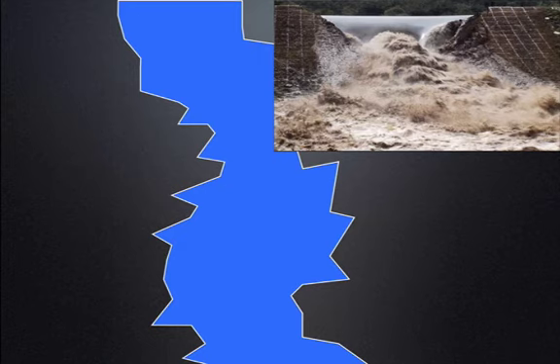But just because your IVC is plethoric and non-collapsible does not mean that you have a fully loaded tank. For example, it could also be that downstream they've built a dam or they've closed off the floodgates, so all the water is now backing up. This would be consistent with a pulmonary embolus or tension pneumothorax or pericardial tamponade or pump failure where there is an impedance to forward flow. So the blood is backing up through the IVC.